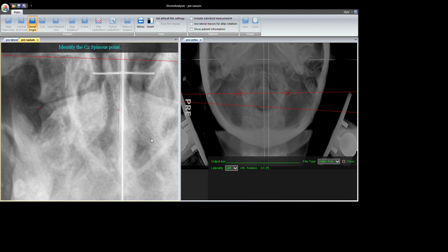So now when we go to here, this whole distance, this is your atlas line, this is where your body center line is. I'm off to the left. That right there is the top of it. Right in here I would say is the bottom, and so I'm going to pick that point right there as my body center rotation. And so you can see how you can correlate across all the films.